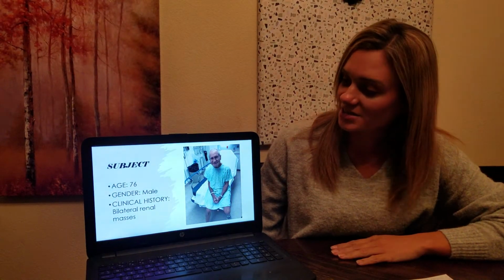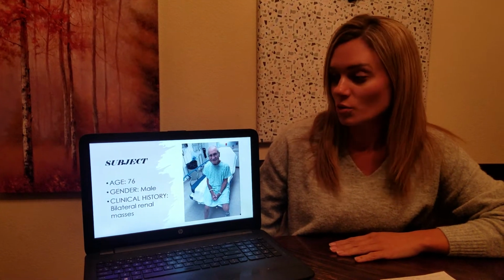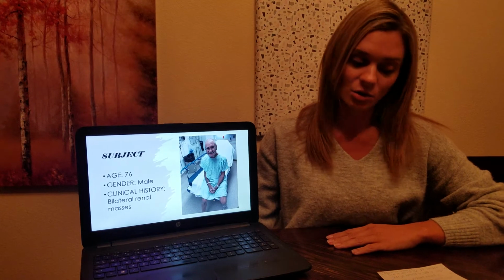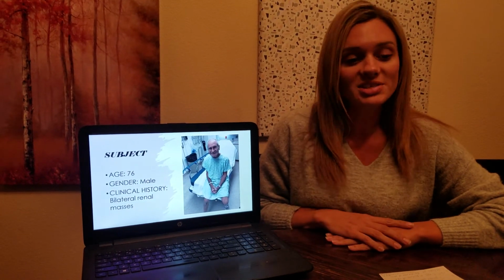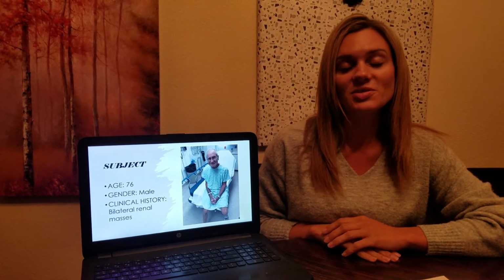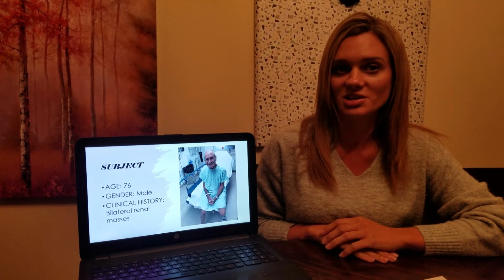The subject for our case study is a 76-year-old male with a clinical history of bilateral masses, which were previously found on an ultrasound. To protect the patient's identity, this is not a picture of the actual patient, and for the rest of the presentation, we will refer to the patient as Bob.